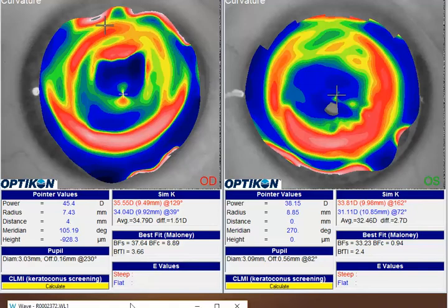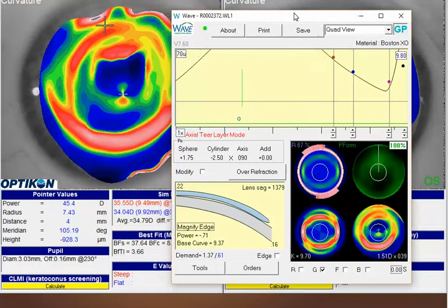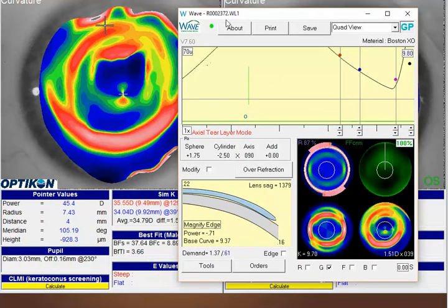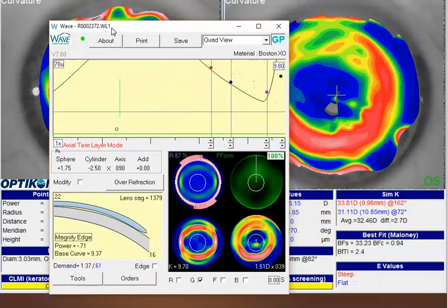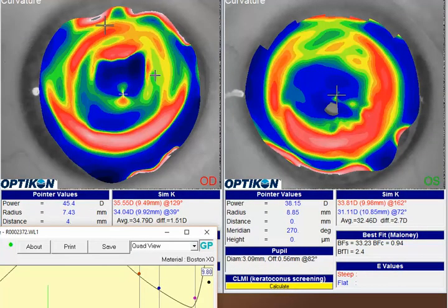So when I look at your design using GSIM, the main disadvantage of the GSIM in this particular case is that with such a difference between, say, 2 and 4 o'clock on the clock dial compared to, say, 6 to 9, superior versus inferior, you've got quite a bit of variation around through here. So sometimes it's hard to get a lens to really match that as nicely as you can. So in those cases, I tend to like to switch over to freeform with the goal of trying to lay this lens out more consistently through the different meridians.